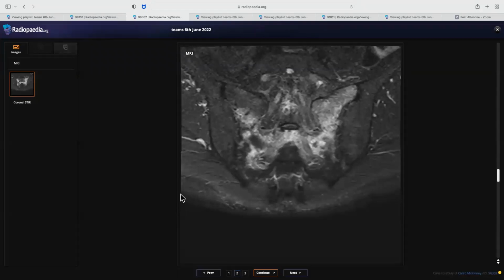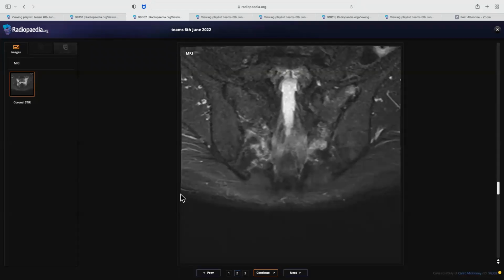showing diffuse hyperintensity and marrow edema sitting within the sacral part in an H-shaped configuration, and there is relative sparing of the iliac bones, and both sacroiliac joints look fine to me, and there is no other obvious lesion seen within the iliac bone and adjoining musculature. So I'm assuming this must be an insufficiency stress fracture secondary to this radiotherapy, as the patient has already undergone the radiation. So I would urgently refer this case to the orthopedic team for casting and further management options. A bone scan would be of added help in this regard.